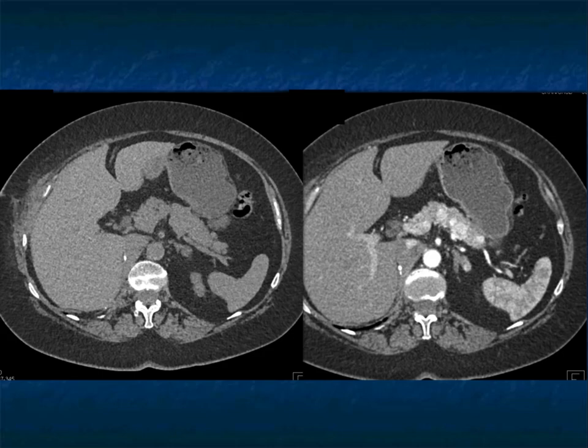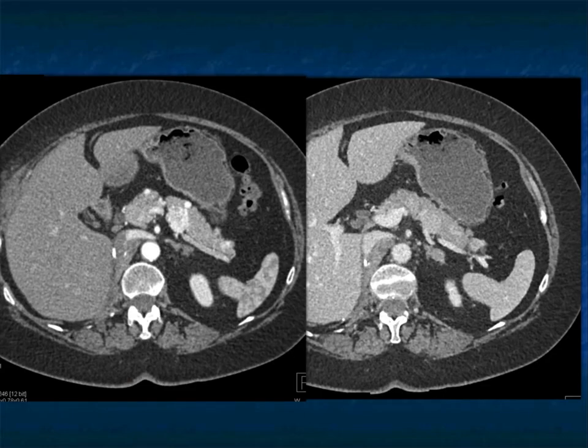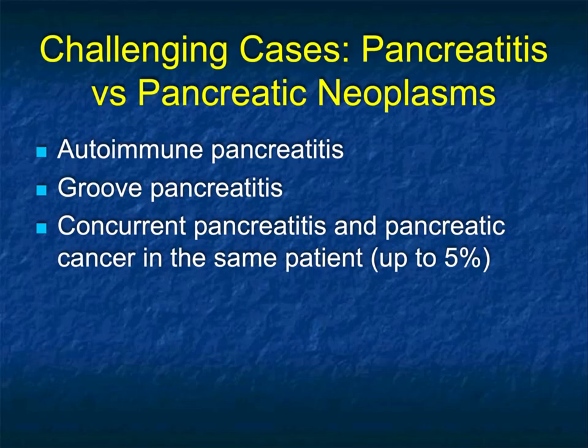So even though you say, oh, the patient is 10 years out, what am I worrying about? You have to be very careful. And look how you missed 6 or 7 metastases to the pancreas. Even in retrospect, that pancreas looks normal. And if you have venous phase imaging, the pancreas also looks normal. So again, the only way to make the diagnosis was in the correct phase.